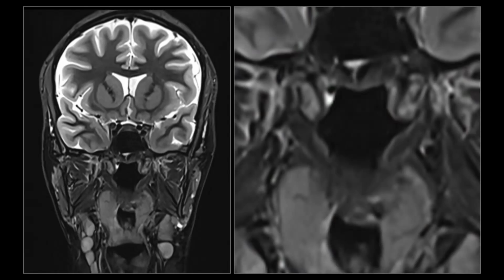As said, we have two muscles that are quite important for opening the Eustachian tube, and these are called the Levator veli palatini and the Tensor veli palatini. Let's magnify this coronal image. I hope you recognize the nasopharynx. This here is the nasopharynx.